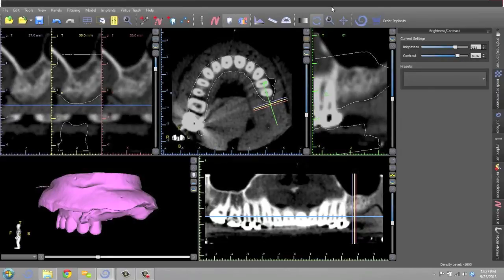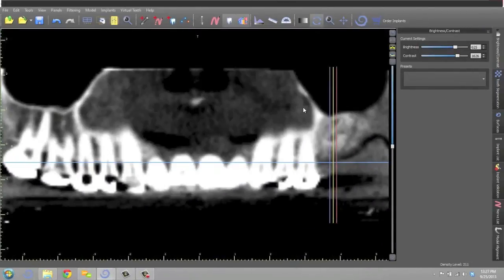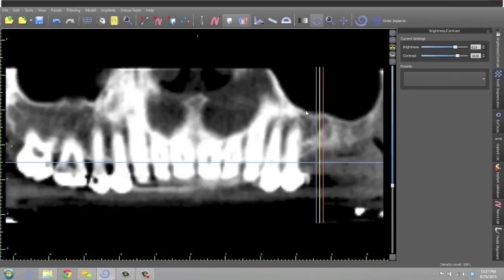Okay. And now I generally start with the pan. And on molars, by default, I usually go with a 5 by 11.5. Not knowing exactly what the bone's going to be, by default, that's where I usually start.